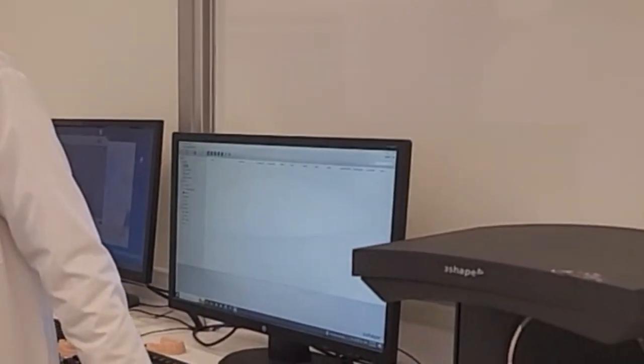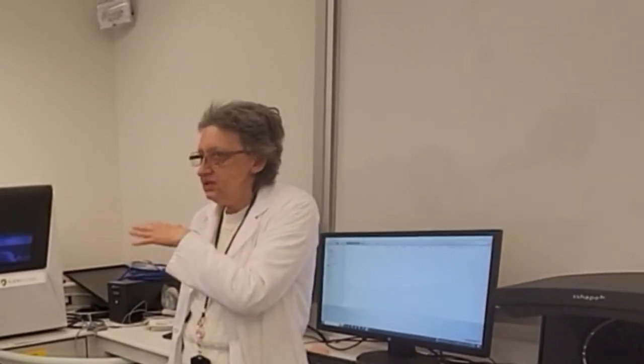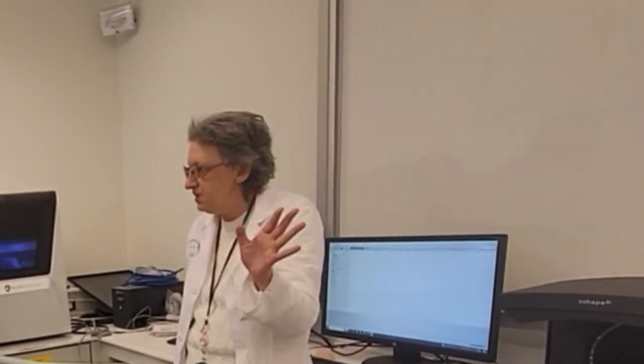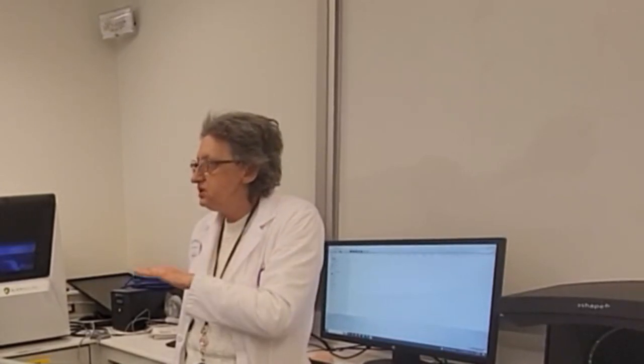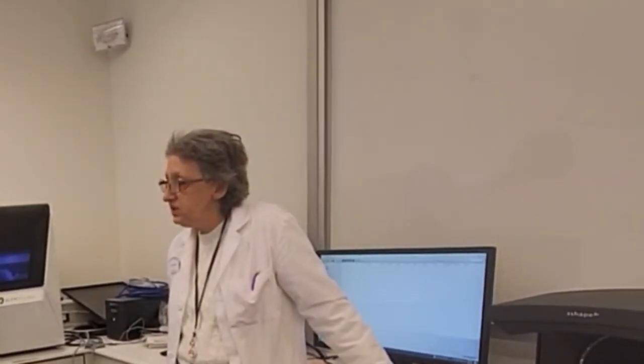We're gonna do now, in this class we're talking about implants, and up to now you did everything by hand. But not many labs today are using analog methods of fabricating different restorations based on dental implants. The majority of them rely on CAD/CAM. So we have the software, we have the scanner, we have everything we need.